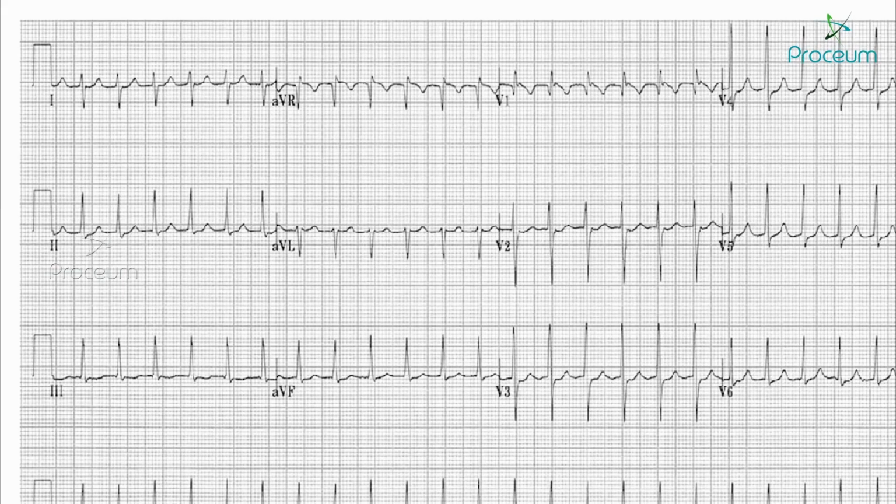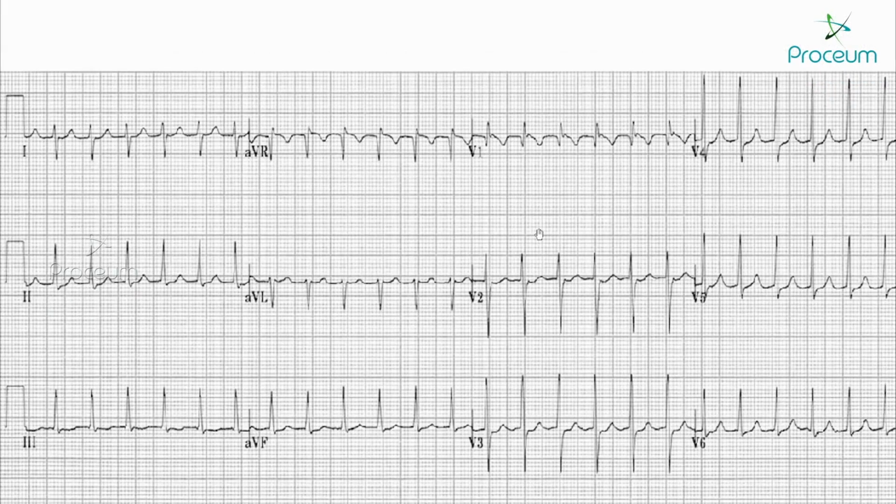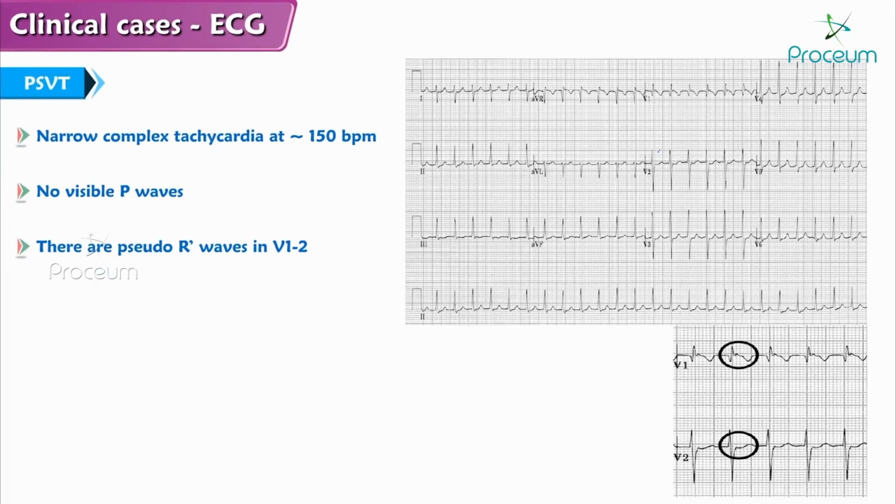So in case of PSVT, you have the presence of narrow complexes. So PSVT is a narrow complex tachycardia.